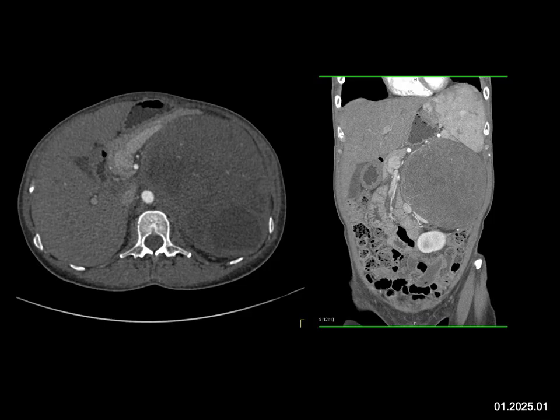Pheochromocytomas can be larger, but they're typically vascular. They can bleed, they can have cystic spaces. You can have cystic pheos, but this is a solid mass. The truth is, if I looked at this lesion, my first thought would be an adrenal cortical carcinoma. Metastasis in a patient with hepatoma, perhaps, where they get large mets, or melanoma would be another possibility. Though in those cases, if one met gets this large in the adrenal, there are usually bilateral adrenal lesions.